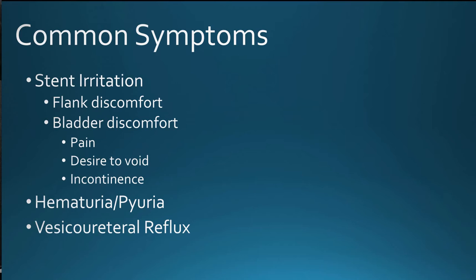So anyways, this sort of summarizes what the typical stent should look like, why to place them, how they're placed, what's a typical or good position for them, and then what are some of the common symptoms associated with them.